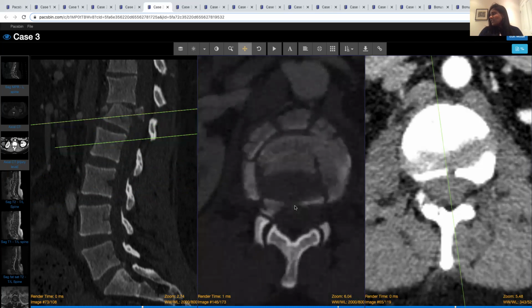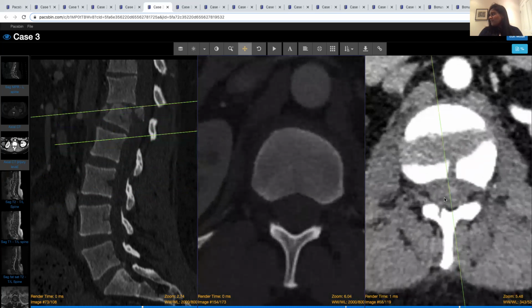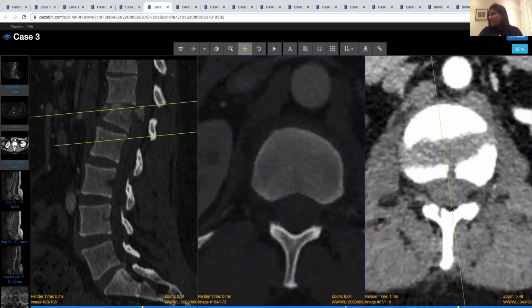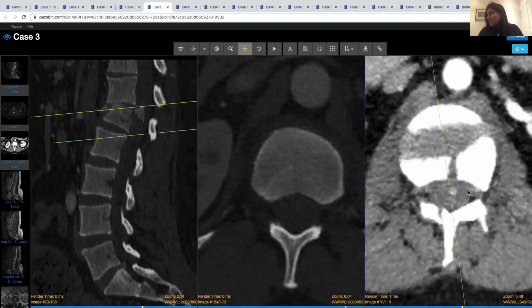But one of the interesting things that I thought was that when you look on the soft tissue windows, you get the impression that below the level of the fracture, you can see the dorsal and lateral epidural fat, and then you get loss of that anterior epidural space and almost an acute angle here that is suggestive that there's a fullness in that anterior epidural space. CT is pretty difficult to assess epidural hematomas on, but there's just a suggestion that you've got something filling that anterior epidural space, because you can make out an acute angle within the fat here.